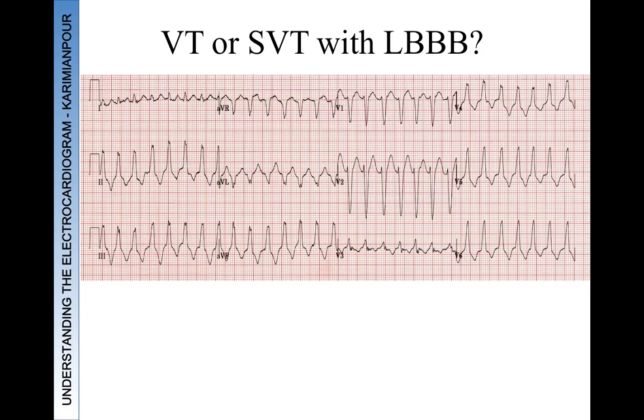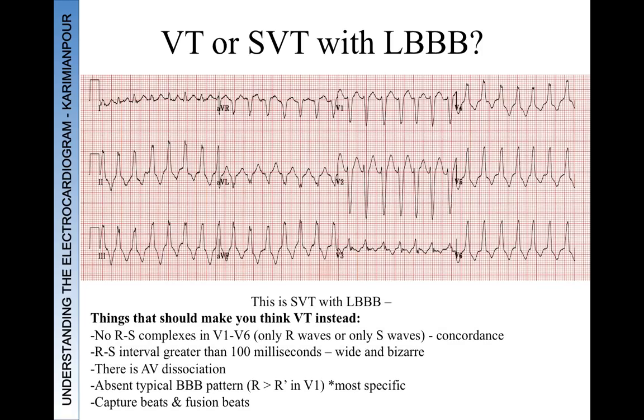So this is actually SVT, supraventricular tachycardia with a left bundle branch block. And if it were to be ventricular tachycardia, these are the things that should make you think that. And this is called the Brugada algorithm, not to be confused with Brugada syndrome.